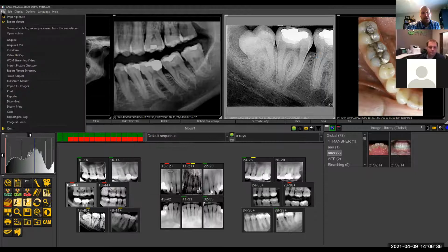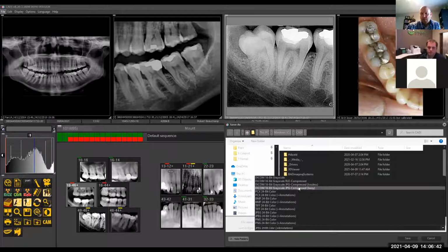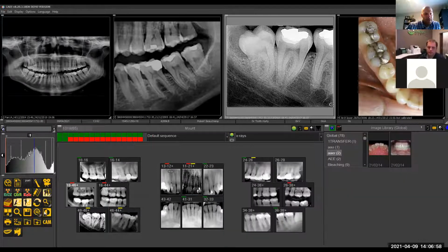And the same when you're doing the export. When you export just a picture, here, when you click down, you can export with 4 different types of DICOM formats. Perfect. So if you wanted to have it lossless or compressed, depending on the size of the image, you could do that and still keep all the original information and the legal information when you're sending it. Awesome.